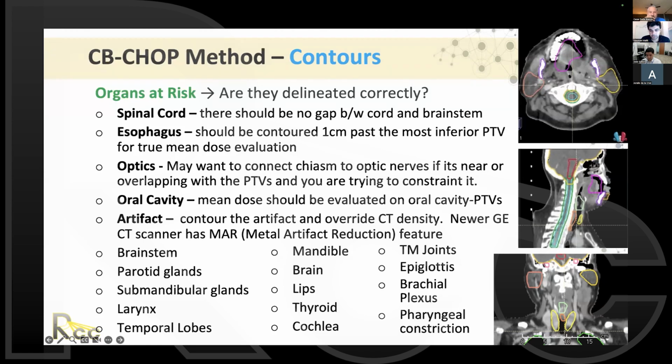So, contouring them accurately, especially around the target where the tumor is, is very important, because how accurately you contour the OARs determines the quality of the plan that you will get and how well the optimizer functions in the end.